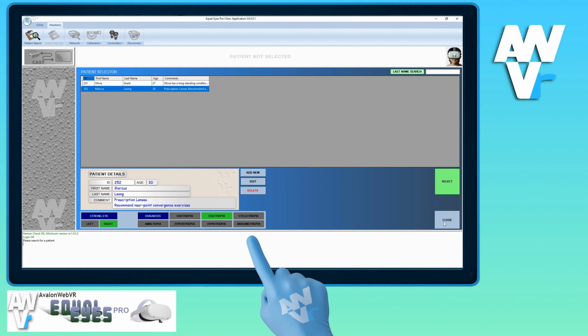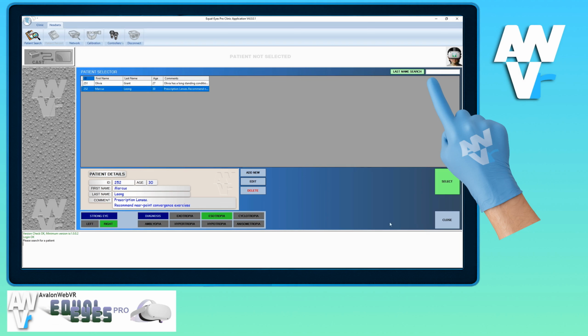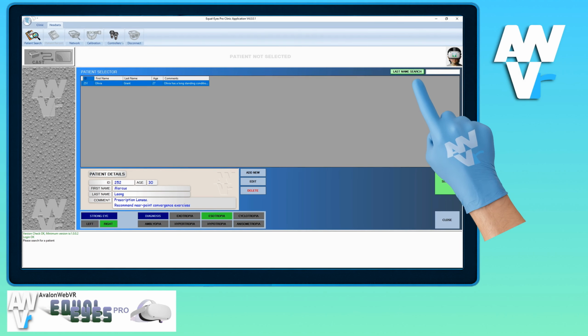If you have a very large list of patients, the application provides a last name search facility. In here, enter the name and click the last name search button. To show all the patients again, simply hit the last name search button with a blank entry.